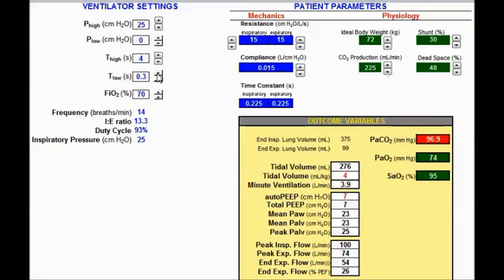And as you can see, we're still creating a little auto PEEP of 7 right down here. So we'll look at the auto PEEP and the ranges to keep these ranges of my tidal volume. And as you can see, I keep on increasing my T-low here, anywhere from 0.2 to 0.8, the common settings used for T-low.